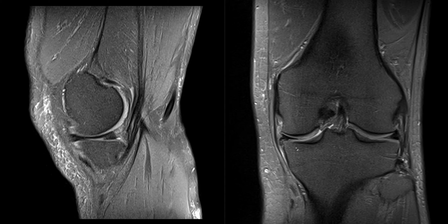Often patients with these small flaps are young and very symptomatic. And also the treatment is easier. Only a small fragment of the meniscus needs to be excised, leaving much of the meniscus and particularly its function intact. So these are satisfying both for the patient and the clinician in terms of symptom relief.